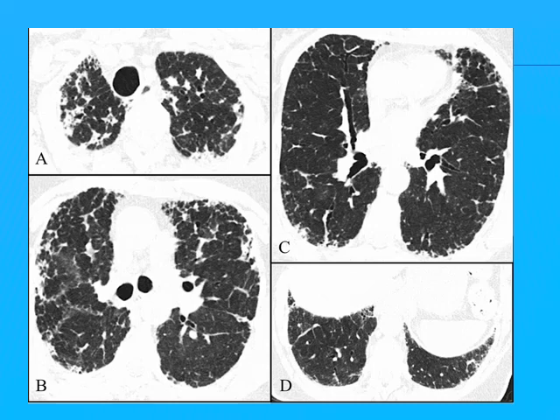If it is stationary, it is not pleuroparenchymatous fibroelastosis. It has a progressive course to diagnose it. Pleural thickening, fibrotic changes, and it can proceed later on to the lower lobes. It starts in the upper lobe.